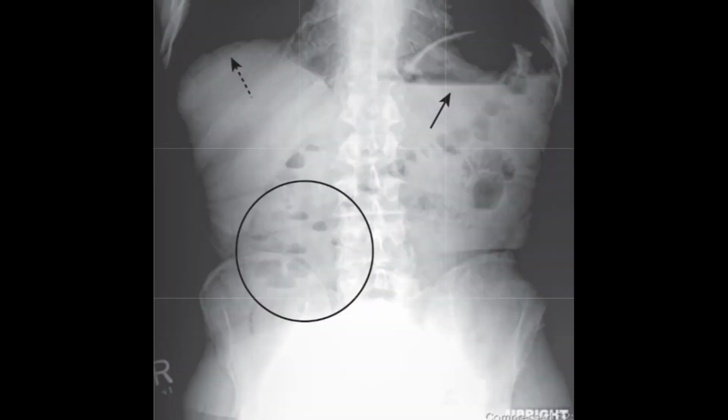The air-fluid levels appear sometimes. The normal localization for these levels is the stomach, especially if the patient had something to eat before the procedure. And you also can see two or three levels inside of the small intestine, where the food processing takes place. But they never appear in the large intestine due to the function of this part of the GIT, that is the absorption of water. So we normally have no free liquids in the large intestine.